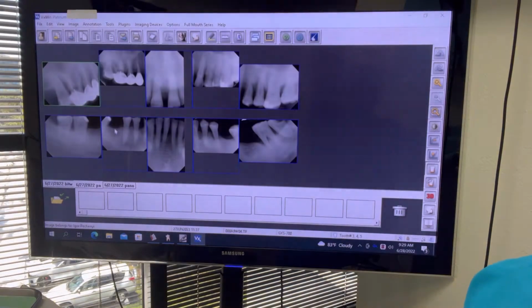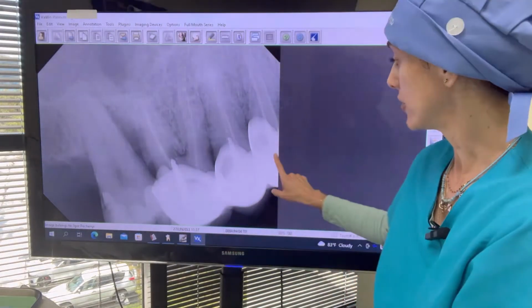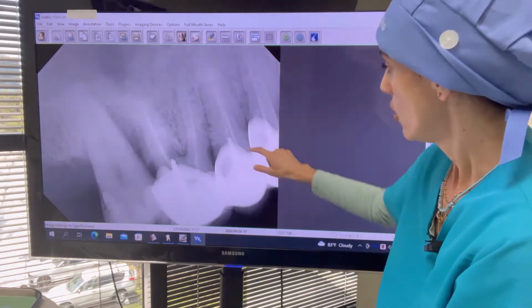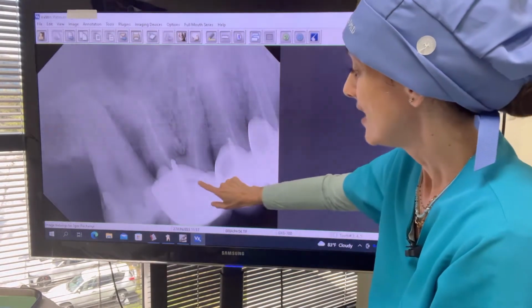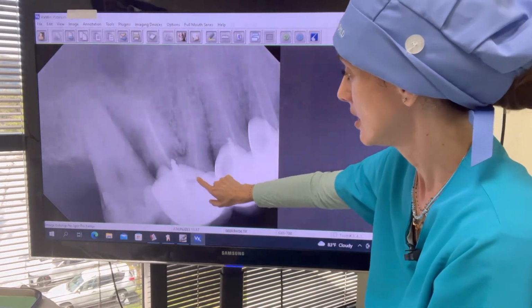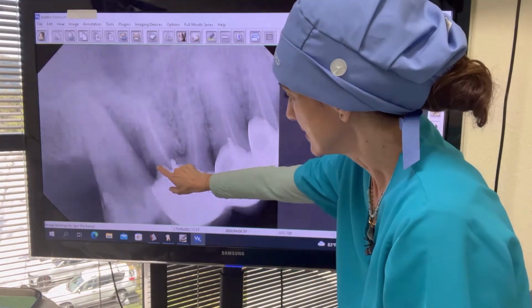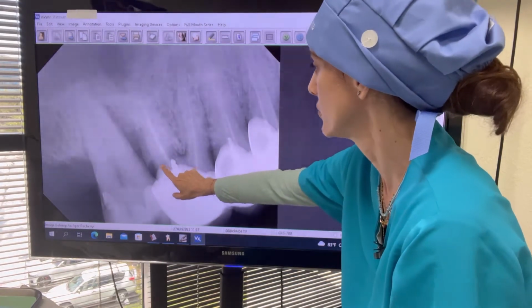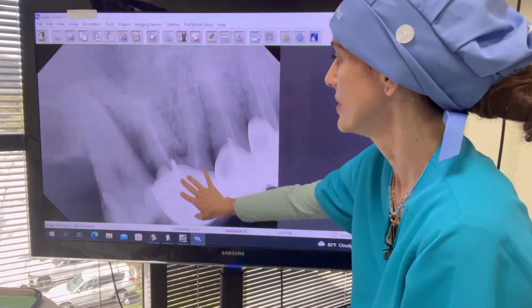Okay. So as I was saying, on the top right, that area of the 3 crowns that are joined together, which I really don't like. Look, here we can see a little dark area. That means bone loss. And look what happened on this tooth here. You see dark here. This is decay, and it seems like this crown was never finished where it should have finished. So it creates an area where the tooth gets decayed, and this will have to be extracted.